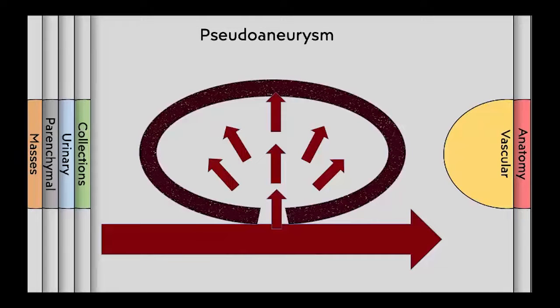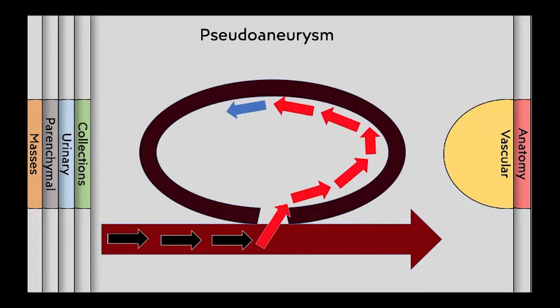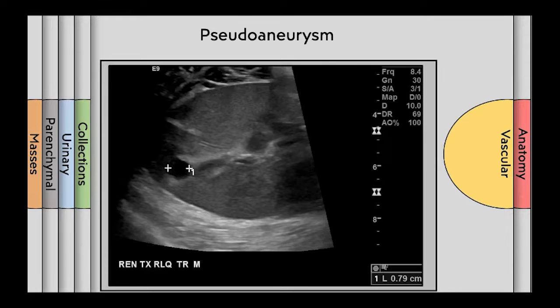Either the blood can coagulate or surrounding structures can enclose the leaking blood, which can either fully clot or, in the case of a pseudoaneurysm, non-clotted blood can flow in and out of the collection. In this depiction, red is used to depict the blood flowing towards the ultrasound transducer and blue away. This gives rise to the sonographic yin-yang sign.